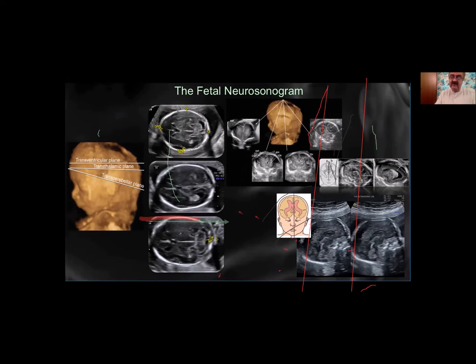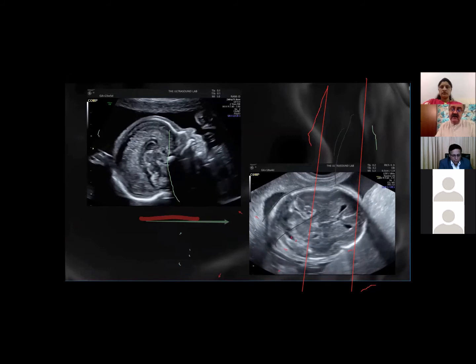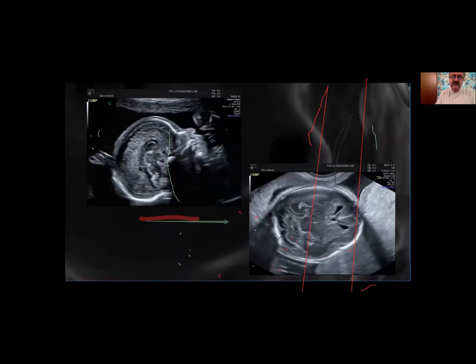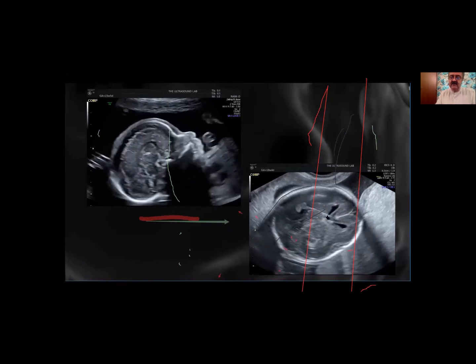And that is what I have shown on these slides here. A lot of this can be seen vaginally. Sometimes it can be seen in thin abdomens transabdominally, but this is the way we like to look for this abnormality. This is how the corpus callosum appears. And in our axial view, it is seen as a rectangular structure here between the two horns.